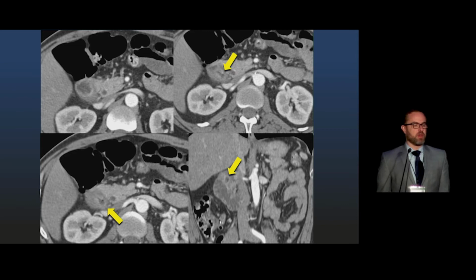This is a more subtle case of peptic ulcer disease, but an important site nonetheless. This is a patient who also has epigastric pain, but in this case, the ulcer is arising from the proximal duodenum. One very important point that I like to teach to my residents is that the vast majority of peptic ulcers in the duodenum occur in the proximal portion or the bulb. The overwhelming majority of these ulcers are benign, and sometimes these can be confused for duodenal diverticula. Again, those usually occur more distally. Groove pancreatitis could potentially occur here, but there's gas within it conveying communication with the lumen. Again, the proximal duodenum is a very important site to interrogate for possible peptic ulcer disease.